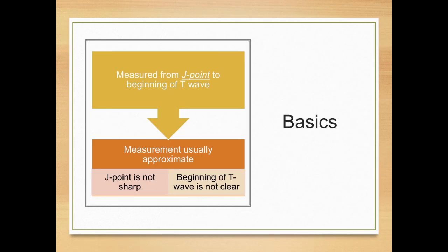We're going to have to practice finding that J point, because we're going to be measuring from the J point. We're going to be comparing the ST segment to the J point. It's not as easy as it may sound to begin with, because sometimes a J point is super sharp. You can see it a mile away.